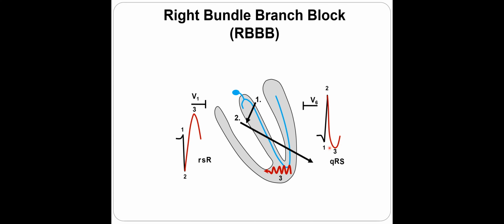Those are the left ventricle leads. So look at the ID time, the VAT. As you see, the ventricle activation time, of course, the last R is longer than 0.04 on the right side, but nothing happened on the left side.